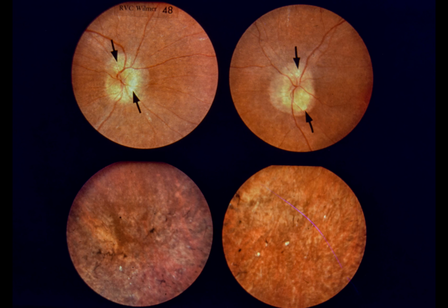The right and left optic discs have irregular margins and contain numerous glistening drusen. Peripapillary atrophy is present, and the retinal arteries are markedly attenuated. Lower left and lower right. The periphery of both fundi contain many areas of hyperpigmentation in a bone spicule pattern. An electroretinogram showed marked diminution of both photopic and scotopic components, supporting a diagnosis of retinitis pigmentosa.